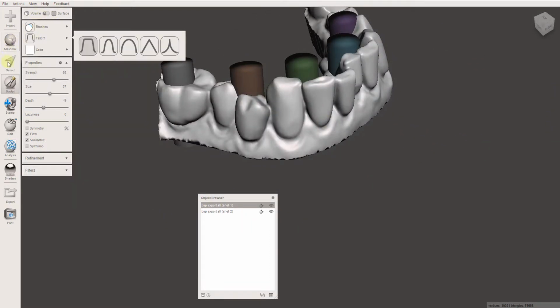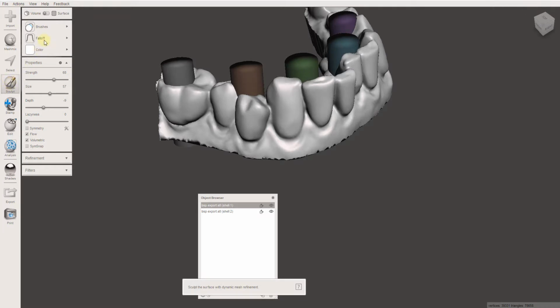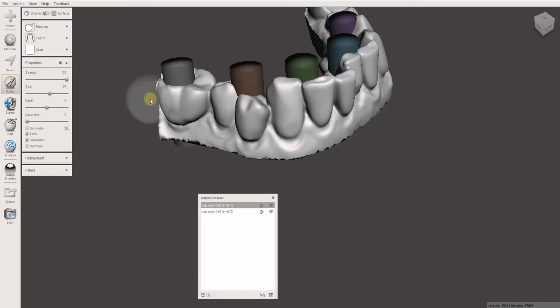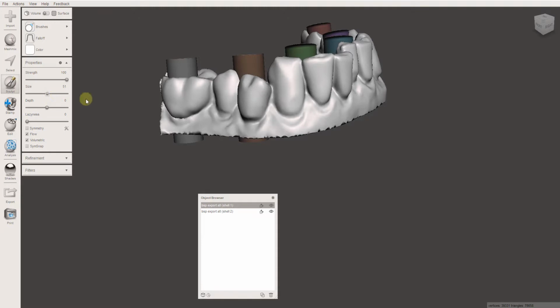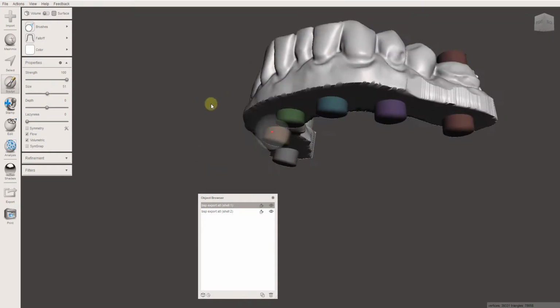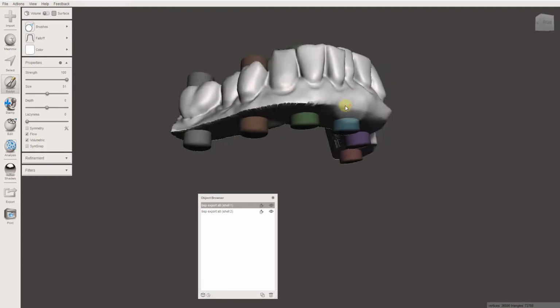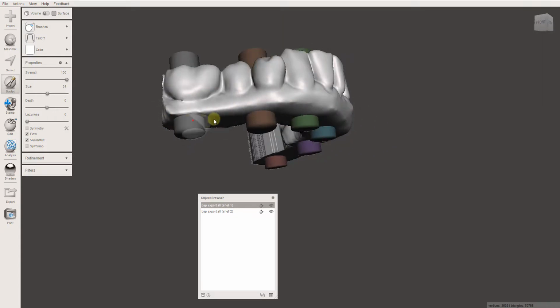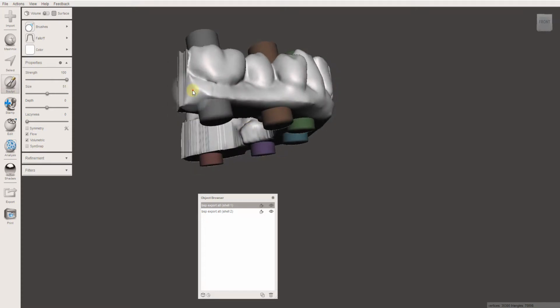So up here, and again, Sculpt, under the Sculpt menu, Brushes. Now we're going to do this Shrink Smooth. I'm going to turn the strength up to 100% and the size, let me shrink it a little, yeah. And so, on the buccal, we're going to use this just to go along here, and we made this sharp cut, and this is a way just to smooth things.